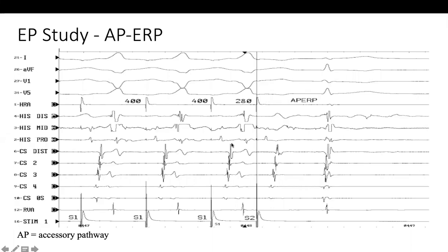Then the S2, there is no V, and there is A with no His. Okay, what is this?